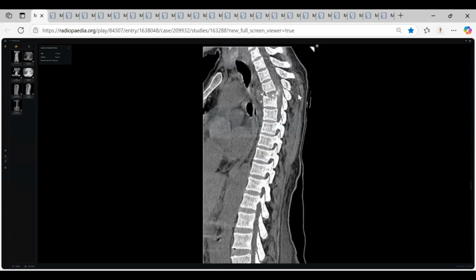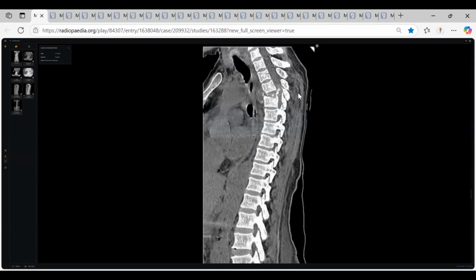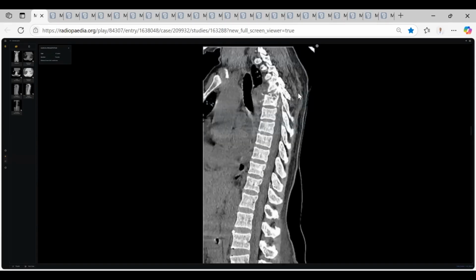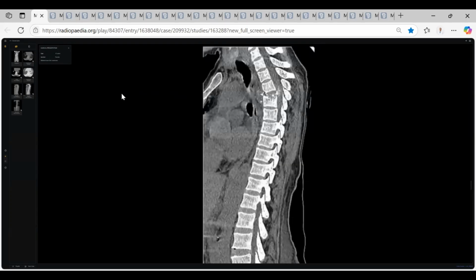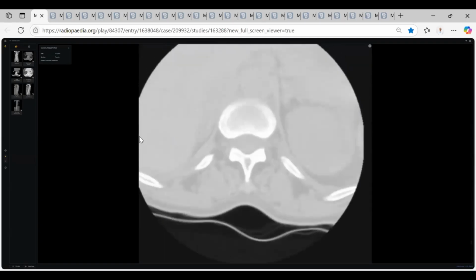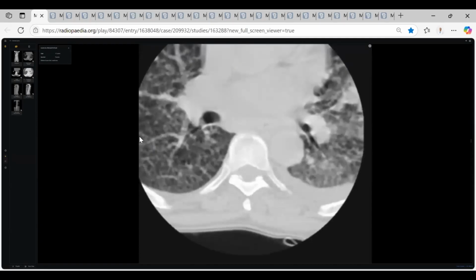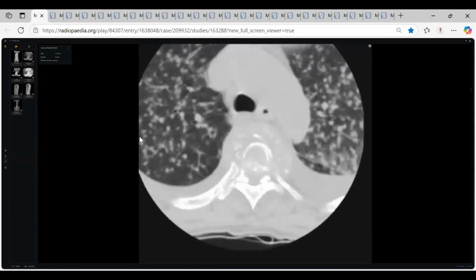Tell me what happened here. Yes, sir. Apart from that, I noticed that there is an abnormal area of hyperdensity within the substance of the cord. This could be due to hemorrhage within the substance of the cord in that area. So retropulsion of multiple fragments due to fractured vertebral segment with cord injury. Also, this happened in the prevertebral area, look here, doctor. What happened?